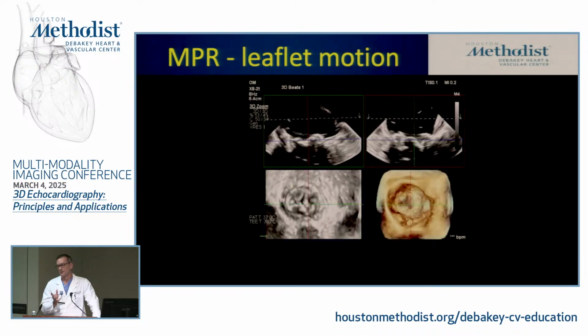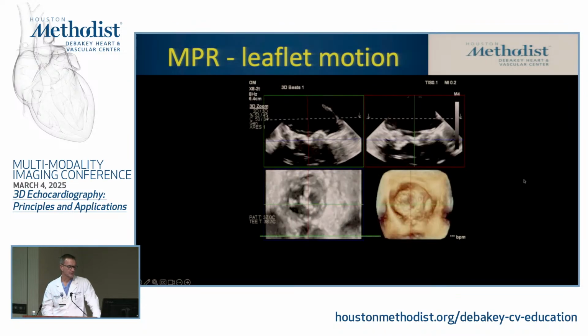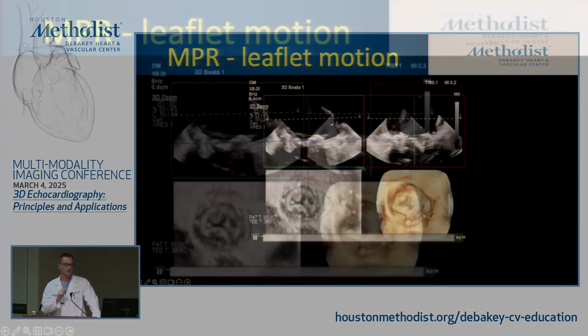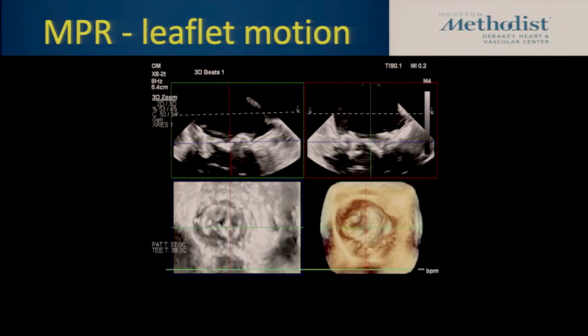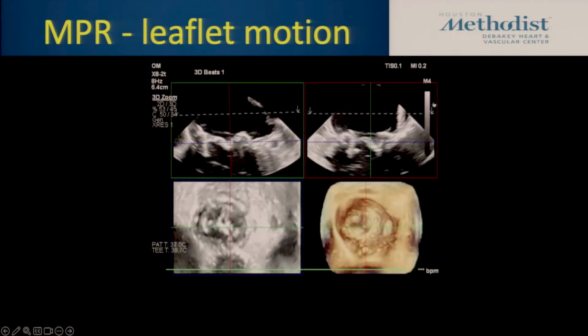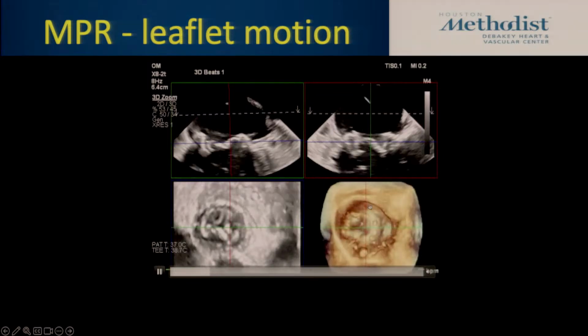The probes were pretty good at this. We got comfortable with the resolution of the volume image in the bottom right, but a 2D derived from a 3D wasn't very impressive. But now it is. So there's been enough technical advancements in the probes and in the software. This is actually becoming a very useful thing.